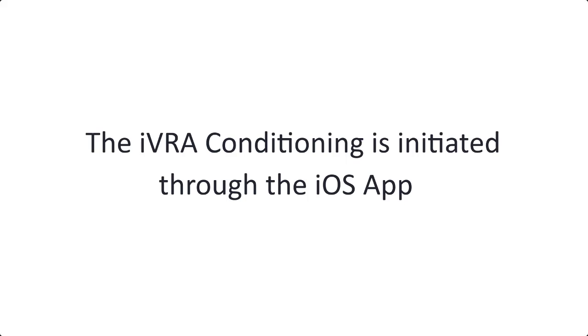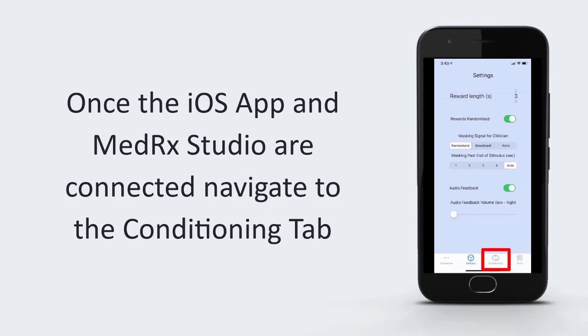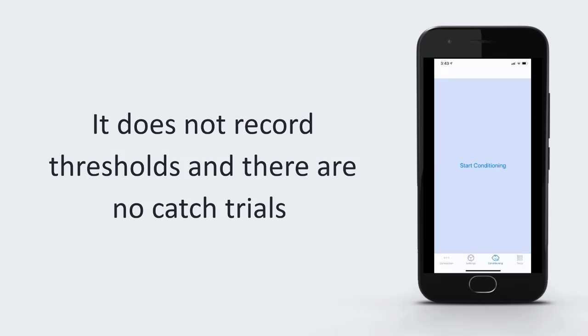The iVRA conditioning is initiated through the iOS app. The iOS app in MedRx Studio must be connected for the testing to begin. Once the iOS app and MedRx Studio are connected, navigate to the Conditioning tab. Conditioning is a test mode used to habituate the patient into responding correctly to stimulus. It does not record thresholds and there are no catch trials.